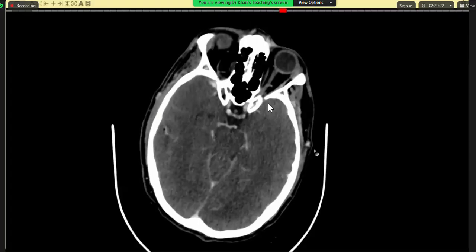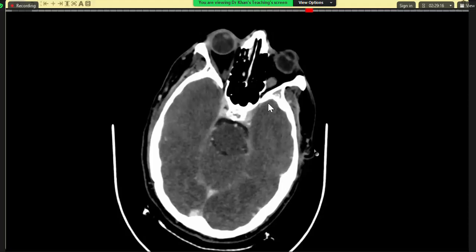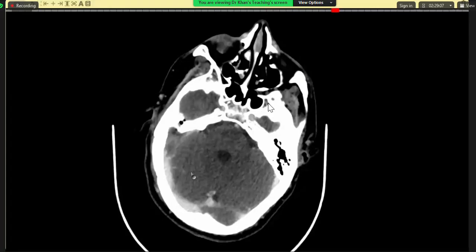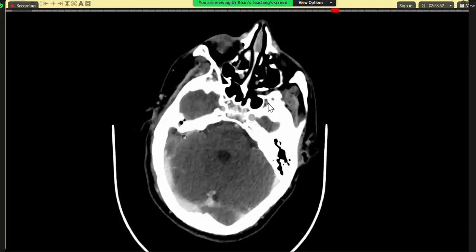Also, there is air at the level which I suspected, and there is a filling defect in the right transverse sinus. Where is the transverse sinus? Sir, not transverse sinus, there is this sigmoid sinus. It is showing expansion with loss of normal filling. Point it out to me. Where is the sigmoid sinus thrombosis? Sir, this one. Mm-hmm, this one.